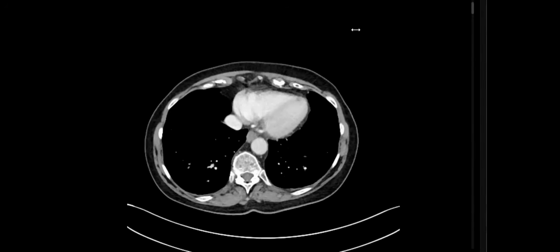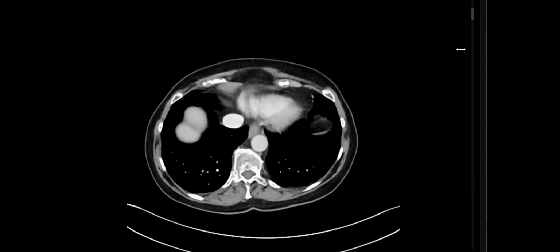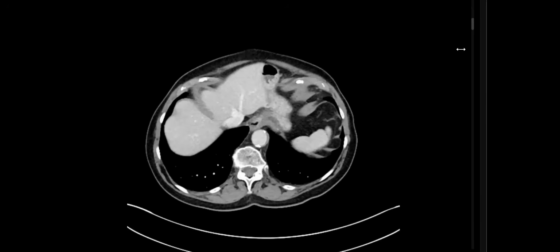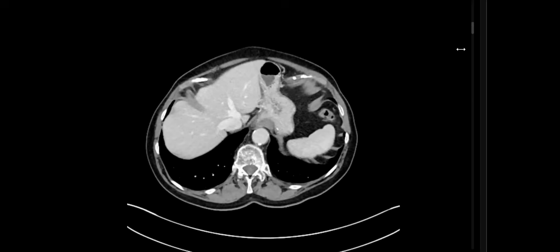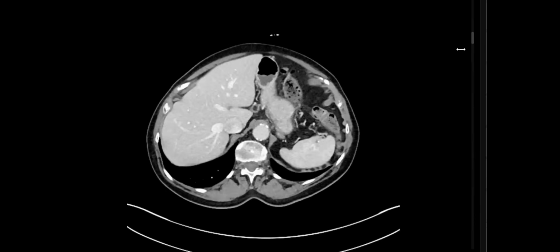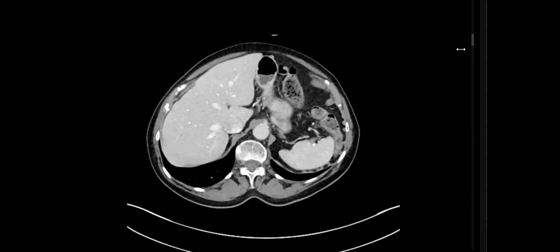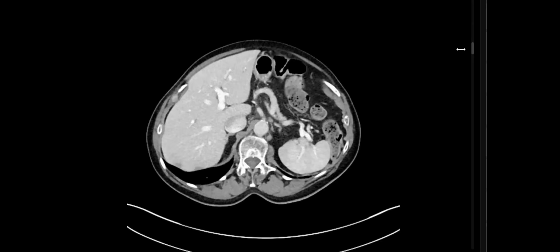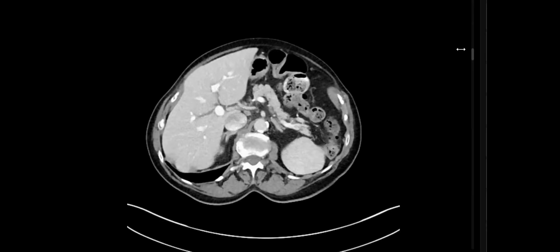Okay, recurrent abdominal pain and fever, as I remember. Let's see what happened. I've been provided with a post-contrast CT abdomen of a patient who has presented with recurrent abdominal pain and fever. The lung bases are included. And bleeding. Okay, fever, abdominal pain, and bleeding. Yes, right. Thank you so much. I'll take a moment to scroll through the images and then start presenting my findings.